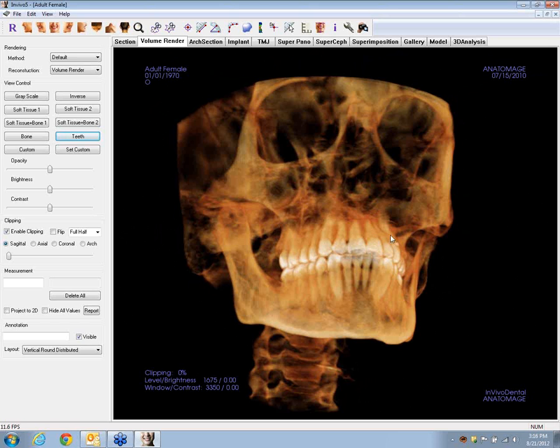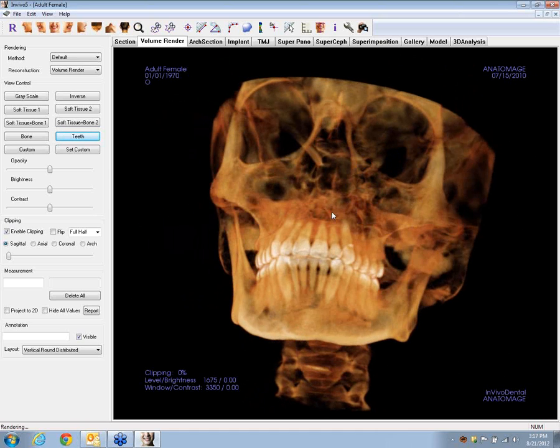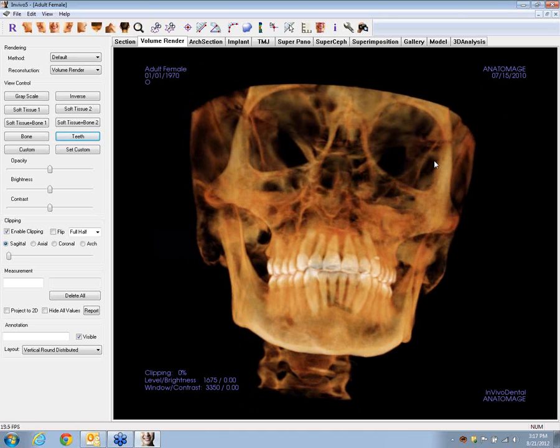By the way, if you save the case, even if you save as, with all that stuff cut away, it comes back without the cuts. The downside to that is you're not going to be able to clean stuff up and save it. So when you clean something up, do a screen capture so that you can see the different aspects of that you want to see. But know that you'll always be able to get back to this point just by saving and reopening the case. All right.